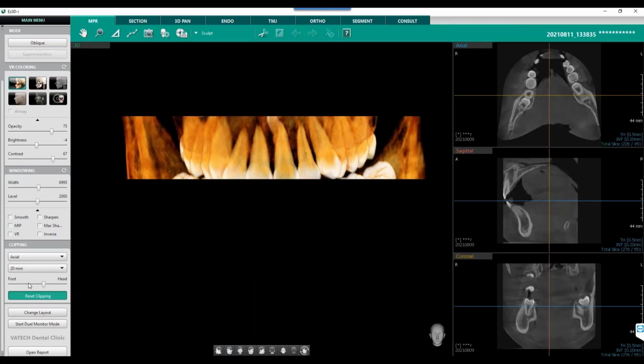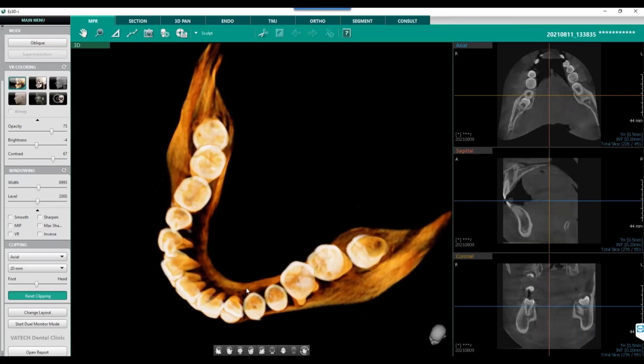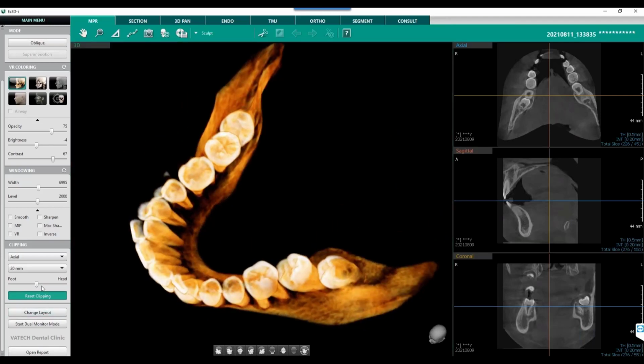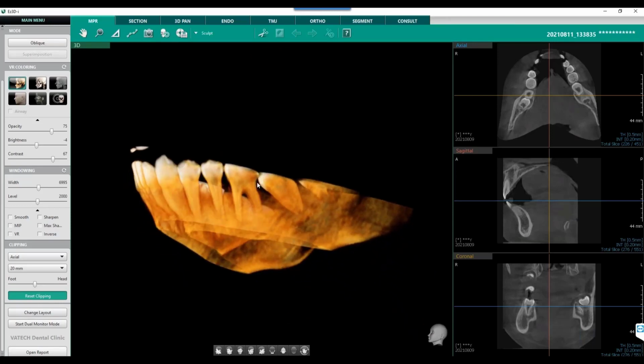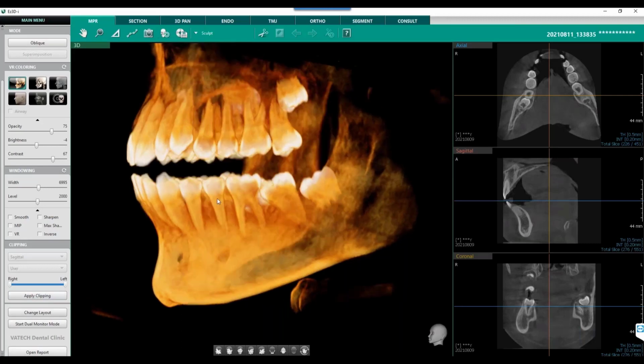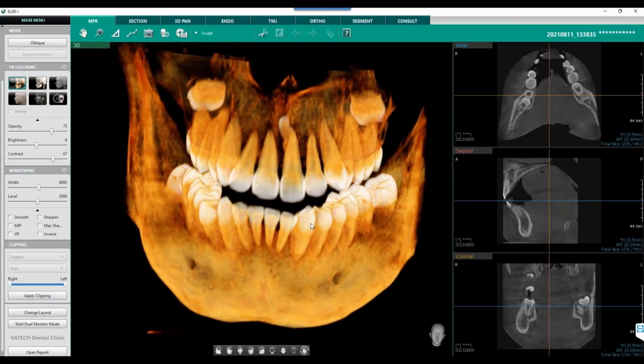Now, we did talk about the mandible here. Let's cut this down and rotate. If I scroll down, we can really see that cut horizontally, and you can see that impingement there. So a lot of different ways to use your clipping over here, specific to this scan itself.